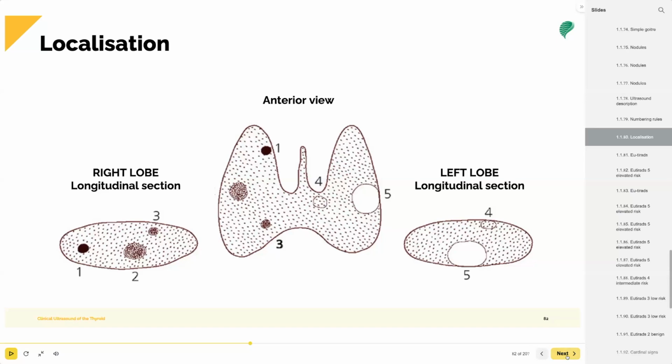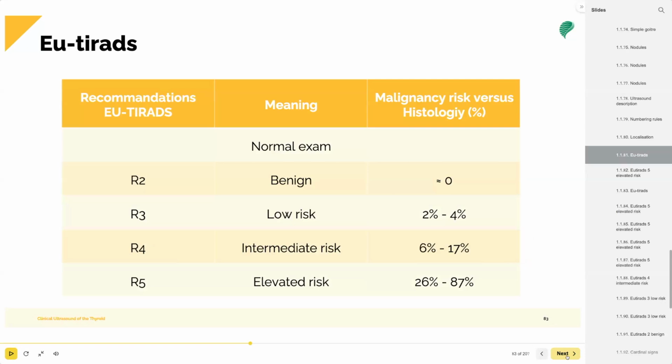So this also depends on the office where you are working and the preference of the doctor. So for thyroids, we do have the grading system 2, 3, 4, and 5. Of course, 2 is benign with very low risk. It indicates usually that it is a benign nodule with an extremely low risk. 1 would just be there's no nodules.